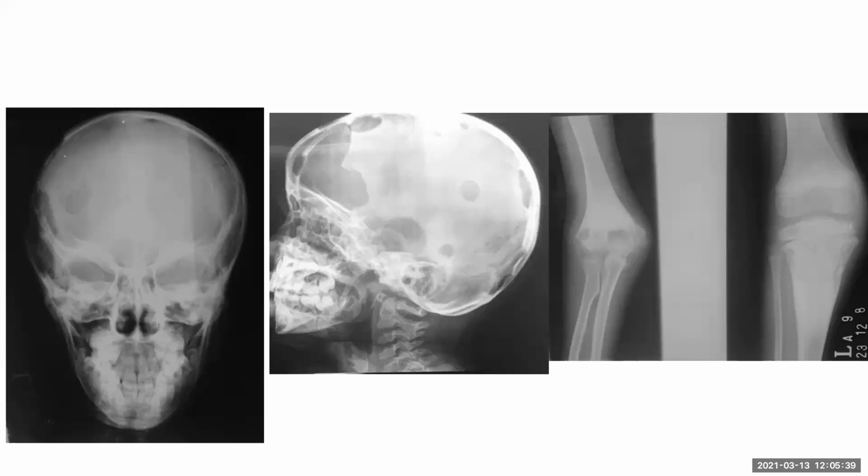There I can see that there are again lucent areas and joint space narrowing in the elbow, and in the knee I can see a sort of permeative pattern in the proximal tibia. So putting all these findings together, eosinophilic granuloma comes to me as a prime possibility, which would lead to such appearance and secondary joint pains.